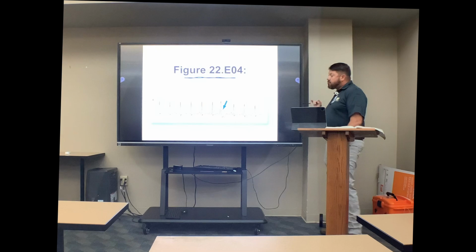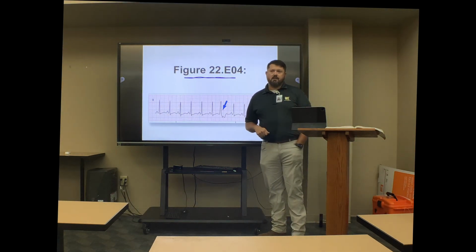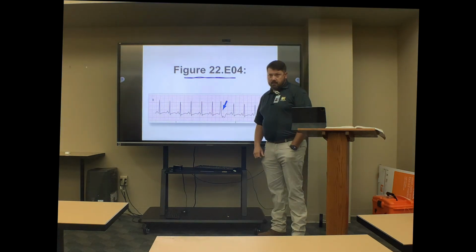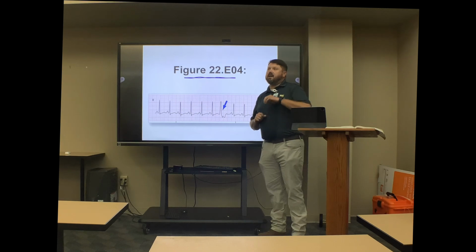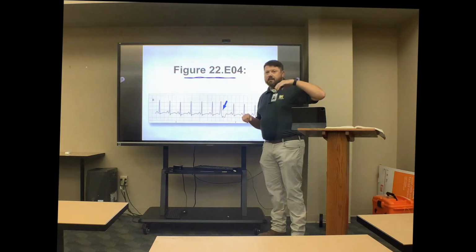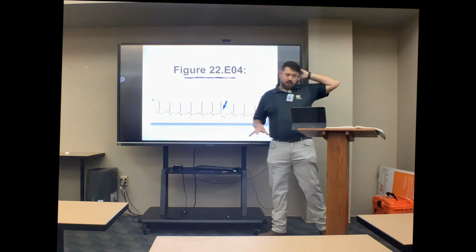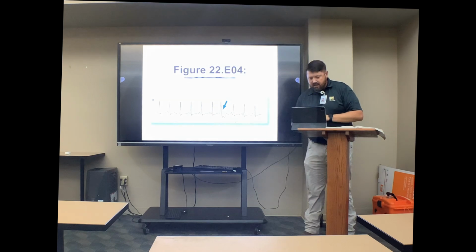But when we get to ventricular conduction, when we get to ventricular rhythms, even the book right here says that it is difficult to determine whether this is a PJC or a PVC. If you were to put PVC on there, I would not count that wrong because it is an aberrantly conducted PJC, meaning that it is occurring outside of the normal conduction. But one of the rules that we said about the PJC is that typically the QRS looks the same and this one doesn't.